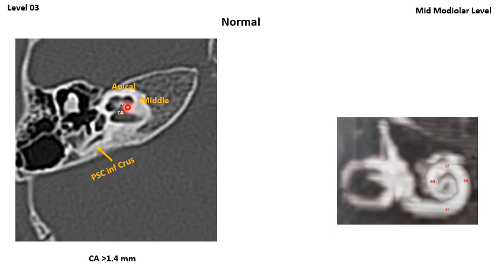And at this level, we will see the apical and middle turns of the cochlea, with the two horns of the interscalar septum between apical and middle turns and the modiolus in the middle. At the same level, we will see the end of the posterior semicircular canal coming as a line posterior to the cochlea, and of course this is the vestibule.